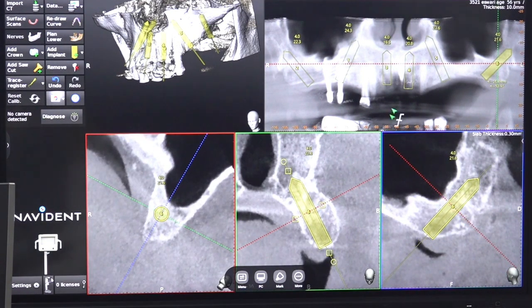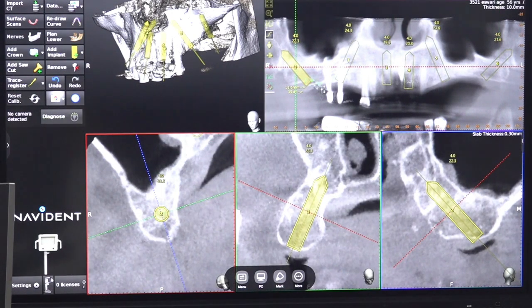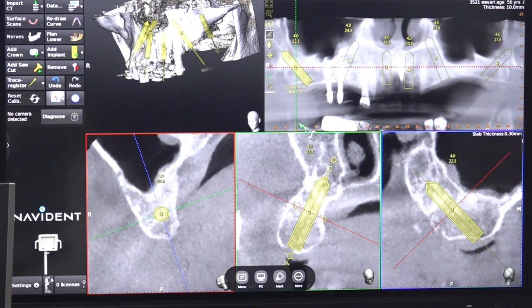So this is the planning for the upper jaw. First we will finish the pterygoid, then we will finish the upper four. Even this patient we can do all on four, but the patient is heavily built with heavy chewing forces we are expecting. So to prevent prosthetic related issues, we are going for pterygoids also.